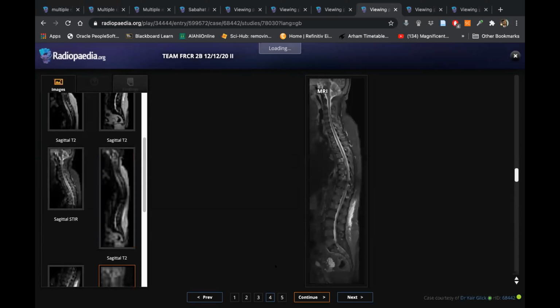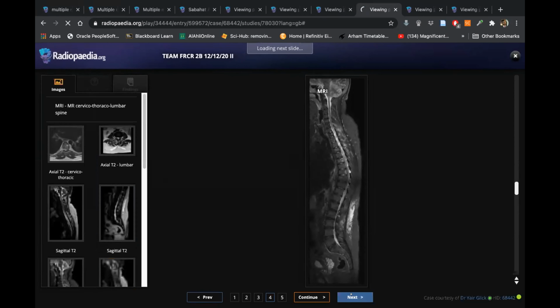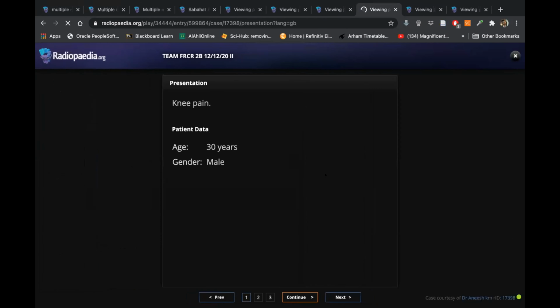Calcified renal transplant noted in the left hypochondrium. And so the findings are overall of end-stage renal disease with renal osteodystrophy, brown tumors, and compression over the cord. I will refer the patient to the neurosurgical team. Excellent. For the treatment. You've got exactly 1 minute for this case, okay?